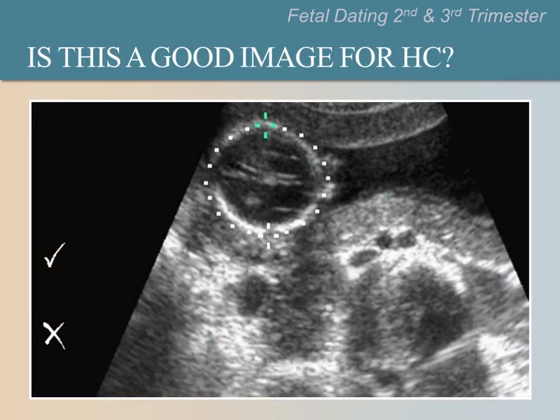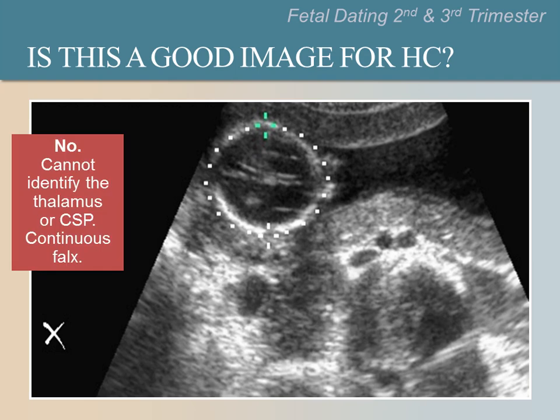Is this a good image to measure head circumference? Why or why not? Please pause the video now to encourage responses from the group. The answer is no, the head is too small to see the landmarks well. The falx is continuous, and there is no thalamus.